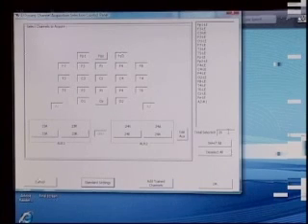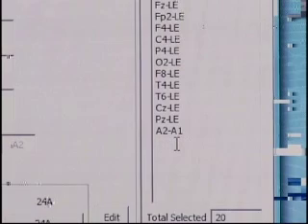So we'll now see there's a total of 20 channels, and you might ask, why is it 20, not 19? The reason is there is a channel which is A2, the right ear, reference to A1, the left ear. All of the channels are actually acquired reference to A1. Internally to the software we compute a linked ears reference, so these all say linked ears because that's what will be stored on the disk. But at the same time we've added A2 minus A1, which allows you to see the difference between the 2 ear leads, which is very helpful.